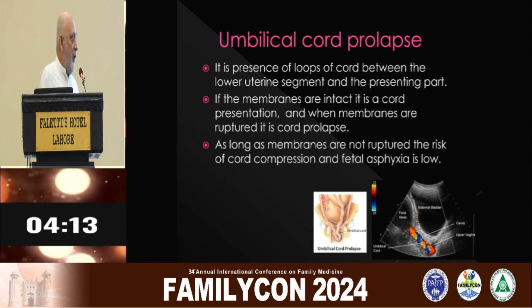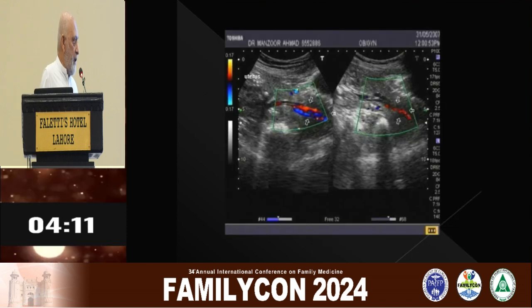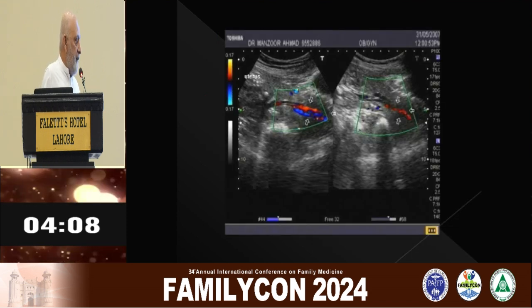That is the last slide. There is the cord in the cervical canal.